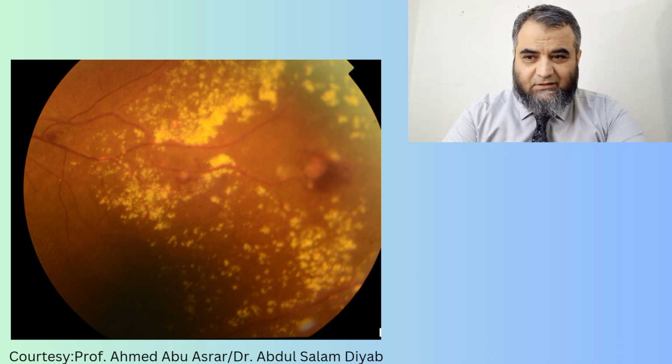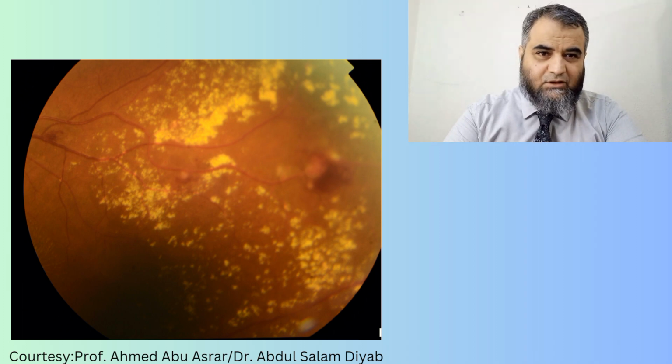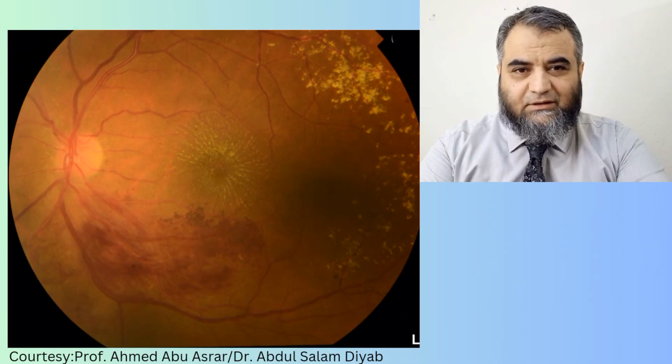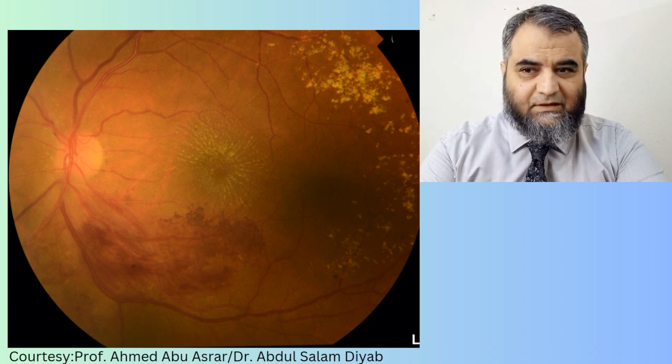You can see widely dispersed hard exudates throughout the peripheral retina in the left eye, and along with that there are hemorrhages, which are pre-retinal hemorrhages, and at some locations you can also see intraretinal hemorrhages. In another slide here, you can see that along the inferotemporal arcade there are hemorrhages, and also exudates going to the macula and the mid-periphery in the left eye.